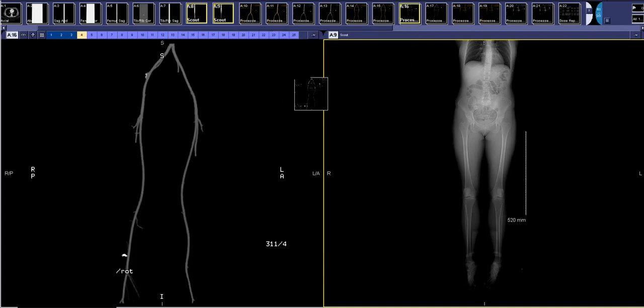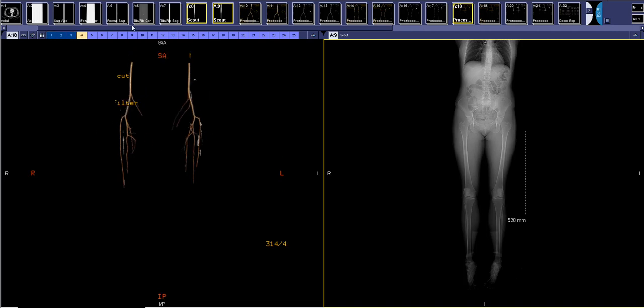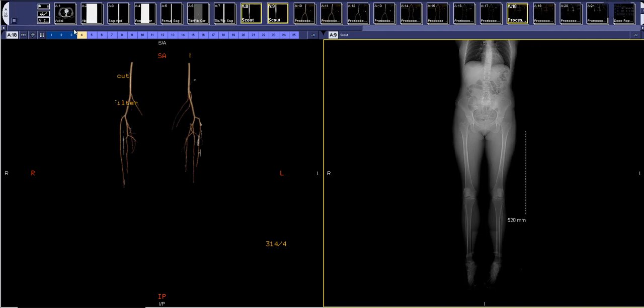Additionally, many places will do reconstruction in the knee, so you can see the tibioperoneal trunks and the proximal aspects of the calf runoff vasculature. So we have all of those. However, I find that most radiologists typically don't even use those for diagnosis. A lot of times surgeons will just use them. They're good to show patients because they're a little easier to understand than axial images.